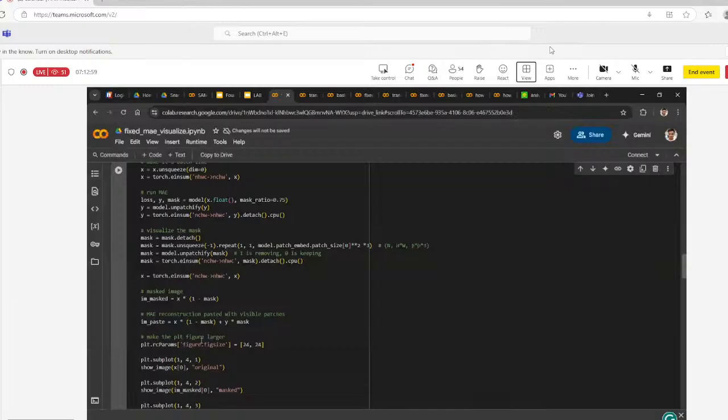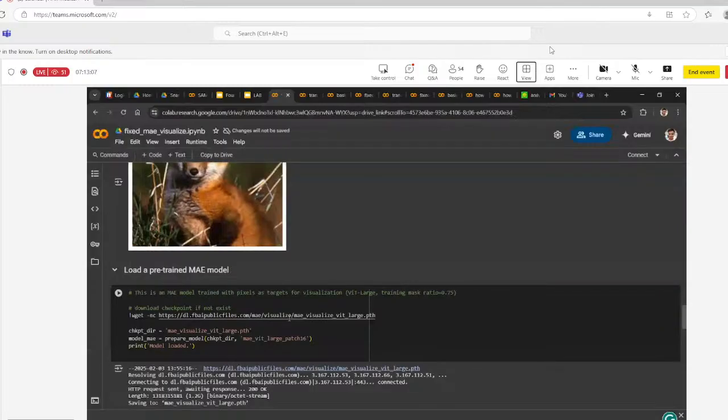And then after this checkpoint, we pass it to the prepare model function. So this is the prepare model that takes the checkpoint directly. And here it calls the get attribute, right? Once the prepare model returns, you get the model with the checkpoint loaded.